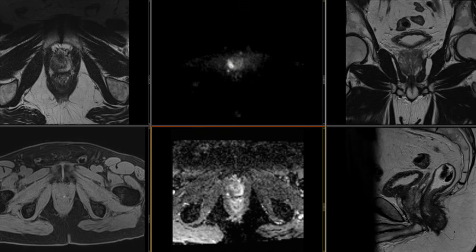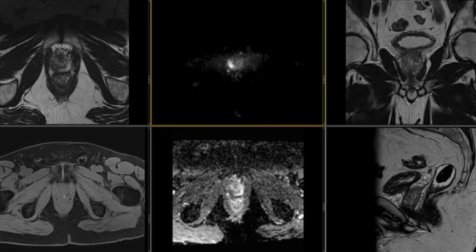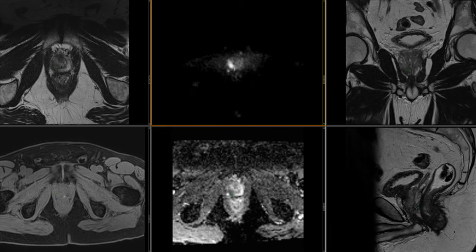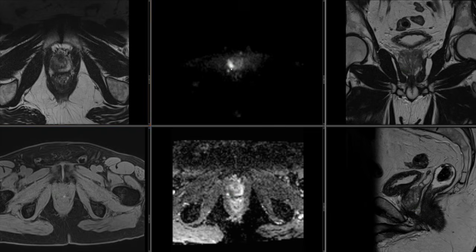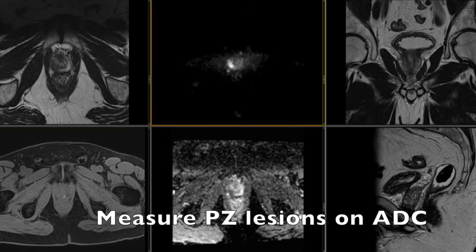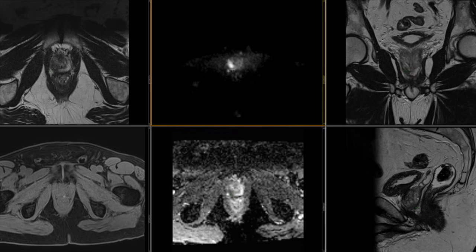So we have a markedly restricting lesion in the apex of the peripheral zone, spanning from the anterior peripheral zone, involving the posterior lateral and posterior medial peripheral zone at the apex. It's T2 homogeneously hypointense. It's markedly restricting. I won't measure it, but it's over 1.5 centimeters. So right away, based on the marked diffusion restriction and size, this is a PI-RADS 5 lesion. This is very likely clinically significant prostate cancer, and it was.